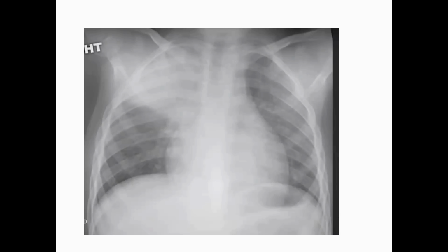You will not almost always see the air bronchogram within the consolidation of pneumonia. If it's an extensive consolidation involving the whole lobe, the bronchus also fills with pus and mucus secretion, so it will block the bronchus. At that time, you will not be able to see the air bronchogram. So air bronchogram is seen only when it is mild to moderate consolidation, still not involving the bronchus. I mean, the bronchus is not filled with pus or mucus secretion. So these are typical features of pneumonia.